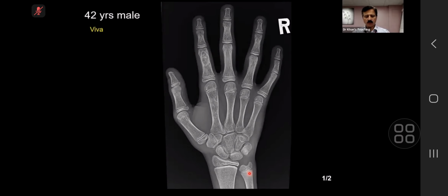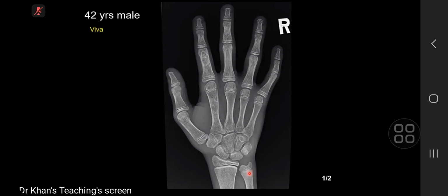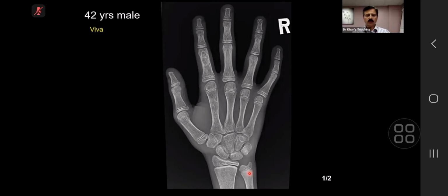There is an abnormality of the right index finger proximal phalanx, which contains within the distal aspect of the diaphysis a well-defined lucent lesion with a thin sclerotic edge that contains some internal matrix with calcification. There's no soft tissue component, no cortical destruction, no significant deformity. It's not particularly expansile. The appearance of this lesion is most in keeping with an enchondroma. It has benign appearances. And what is your differential?